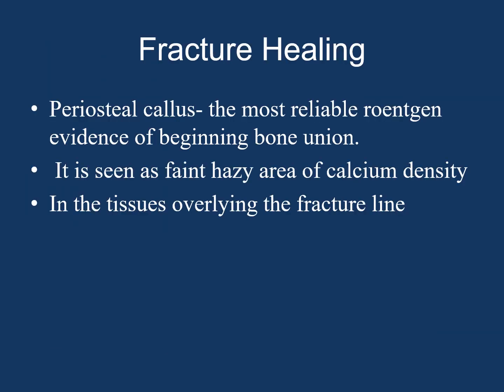Fracture healing. If we know how to look at the fractures, whether they are linear fractures, usually presenting as a radiolucent focus, or if we have an impacted fracture, it will appear as a radiodense structure. We also have to know fracture healing. And the most reliable Röntgen evidence of beginning bone union will be the presence of periosteal callus.